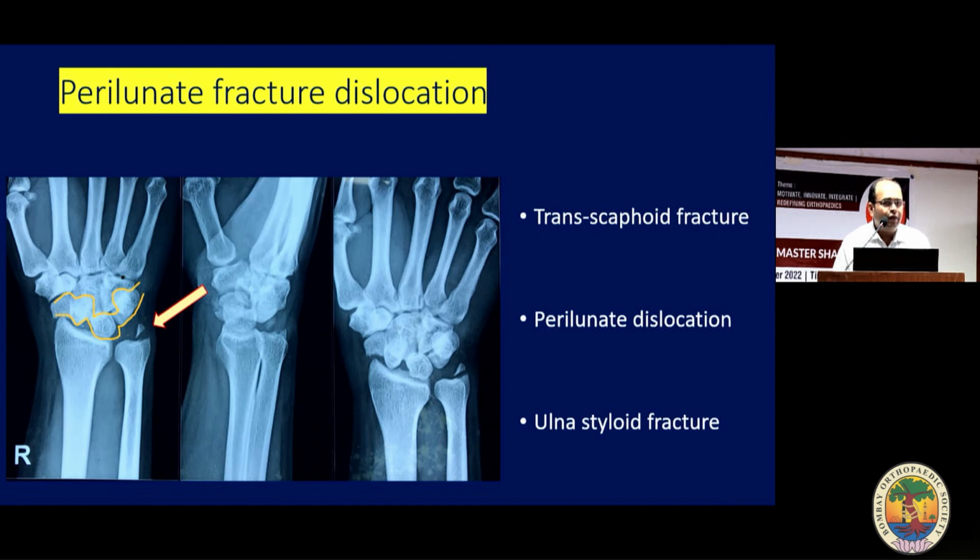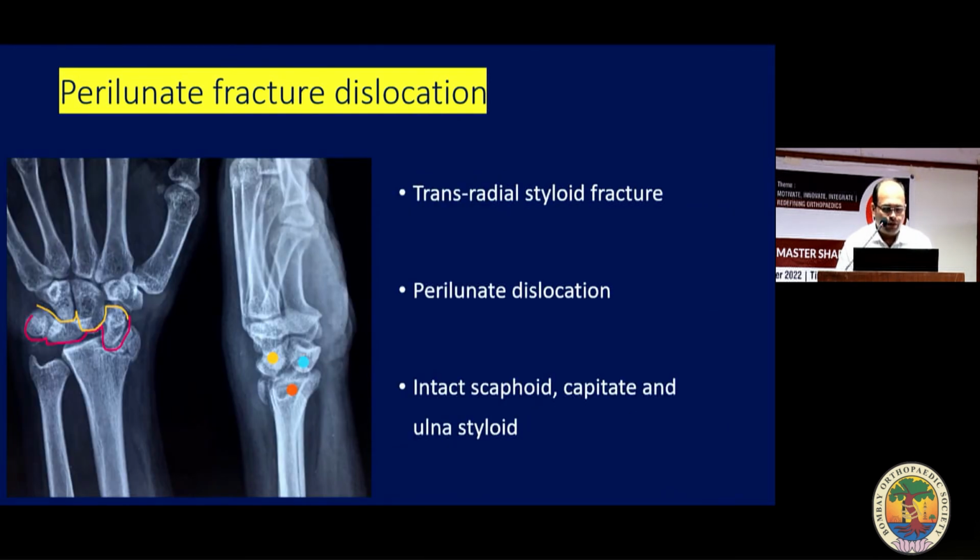Here the force has gone through the trans-scaphoid, capitolunate, then perilunate, and then through the ulnar styloid. So this is how the force has traveled. This is the distal radius, lunate, and this is the capitate, so this is a perilunate dislocation.